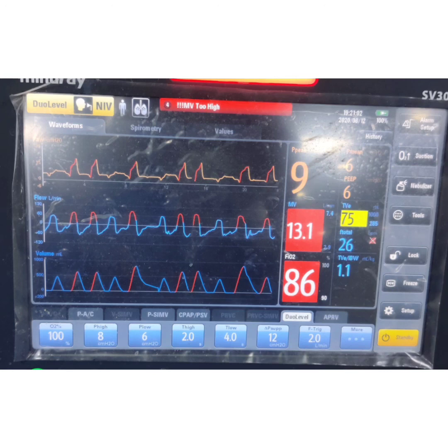This is confirmed by the flow wave, where exactly below it, it is denoting inspiration occurring and expiration occurring. So inspiration and expiration can occur both during P high and P low. It is a very common misconception among people that the positive wave is inspiration and the flat line is the PEEP value. But it is not true in duolevel mode of settings.